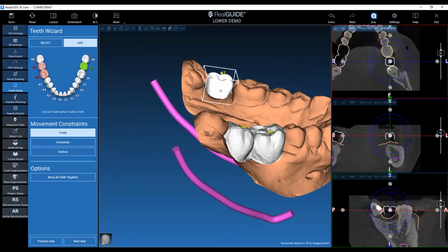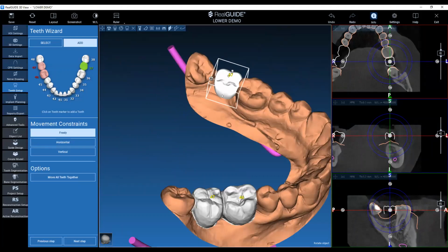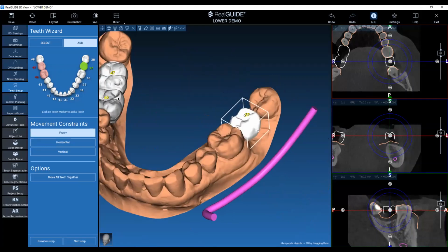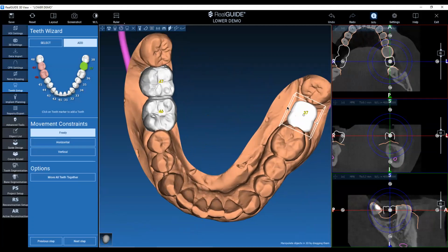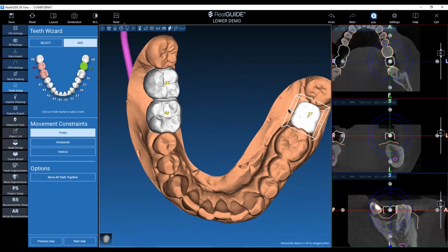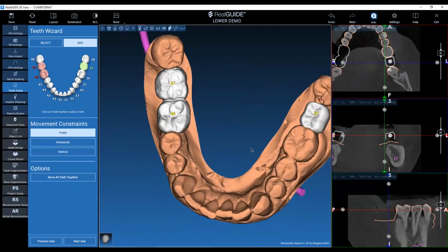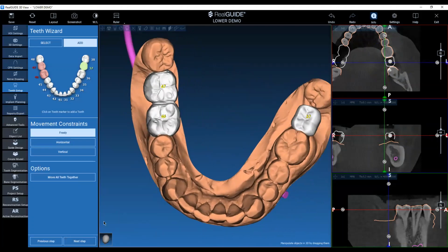You can also change the orientation by using this circle here from the 2D. You can change the dimension of your element in different directions. You can rotate and you can move, as you wish. Make it larger. This is useful as a navigation tool if you want to understand where you are and where your prosthetic exit will go after you have placed an implant here. We have finished, so as usual, we can click on next step.